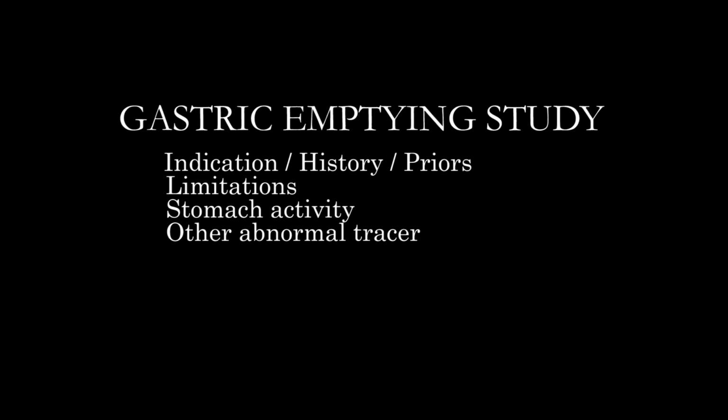So big picture again, how do we approach the gastric emptying study? We want to first understand what is the concern, what is the clinical context, the anatomic background of the patient, what are the things that impact GI transit, and then what are the things that affect the quality of the study: how much of that tracer was actually ingested, is our ROI good, does the patient move. Then we want to track that activity over time, comparing it to the usual thresholds, and then we're going to do a last check and make sure there's not abnormal tracer elsewhere. It's generally a pretty straightforward exam.